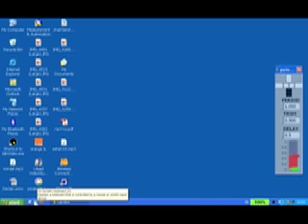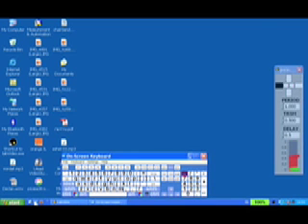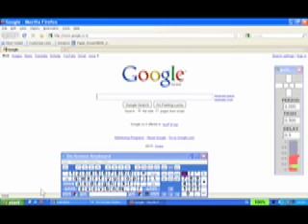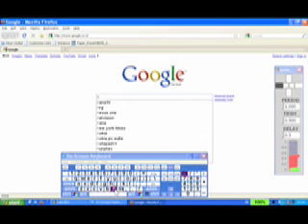And now the mouse click button will be selected by a sniff, and this brought up the virtual keyboard. Now the cursor was moved again and stopped by a sniff, actuated by a sniff, selecting the web surfing software. Once again, the cursor's motion is selected until it enters the virtual keyboard, stopped by a sniff, and the letter N was selected.